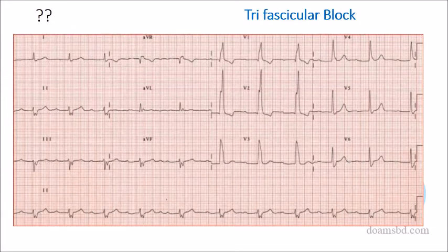Now, what other branch component? The other component means from the left bundle. It is called anterior fascicle, posterior fascicle. How to identify? By telling about the axis deviation. I think you attended before, some of you, in our classes, right axis, left axis. Is there any problem of the axis? Those who attended, try your best.